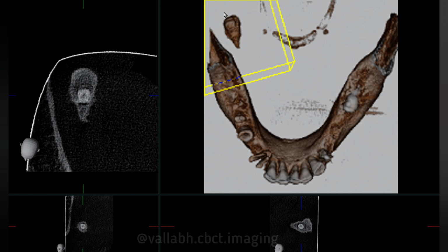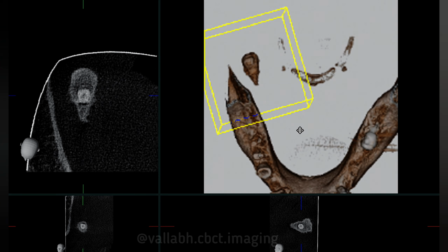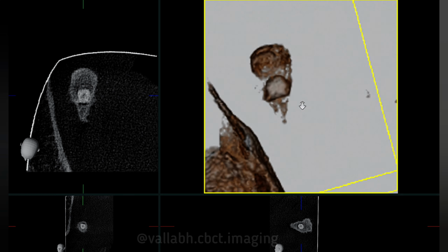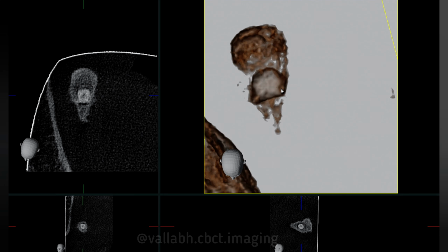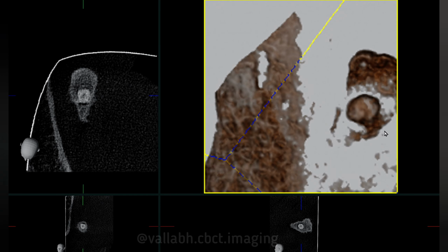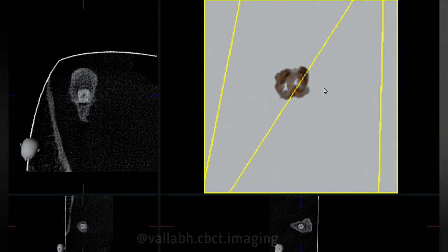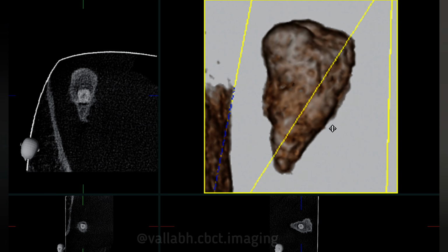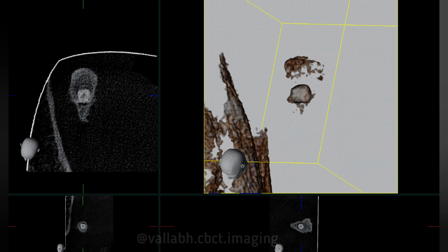So this is the salivary gland stone mass that was seen. There's the axial view, and this is the radio opacity of this salivary gland stone. We'll reduce it, and you can see a tooth-like mass over here. This is like an enamel surface, the root surface partially seen, could be something like that. And this is the radio opacity of the tooth-like structure. You can see this, and this is again the radio opacity of the salivary gland stone and that of the tooth-like mass. Now we'll arrange it again.